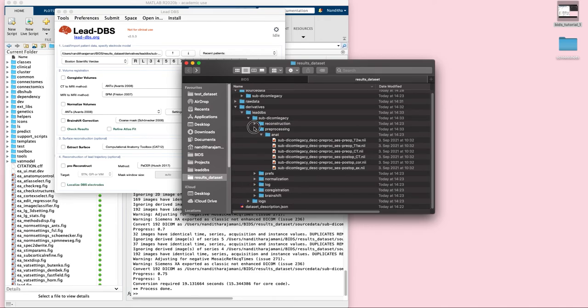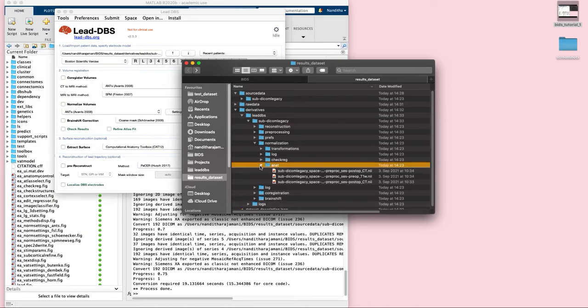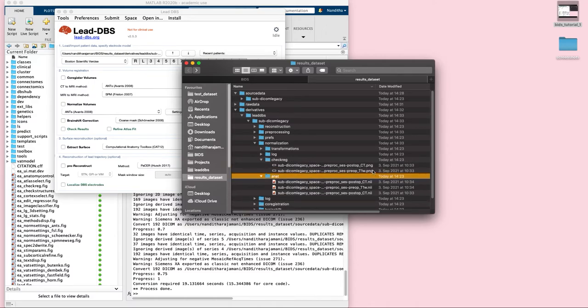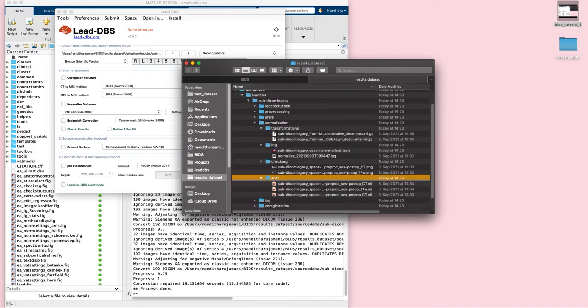Let's also take a look at some larger step, for example normalization, which is further divided into four subfolders, that is anat, checkreg, log, and transformations. The anat contains all the NIfTI files, the checkreg contains PNG files and other image format files, which are used for checking the quality of the registration, and then log will contain the log files, and transformations the transform files.